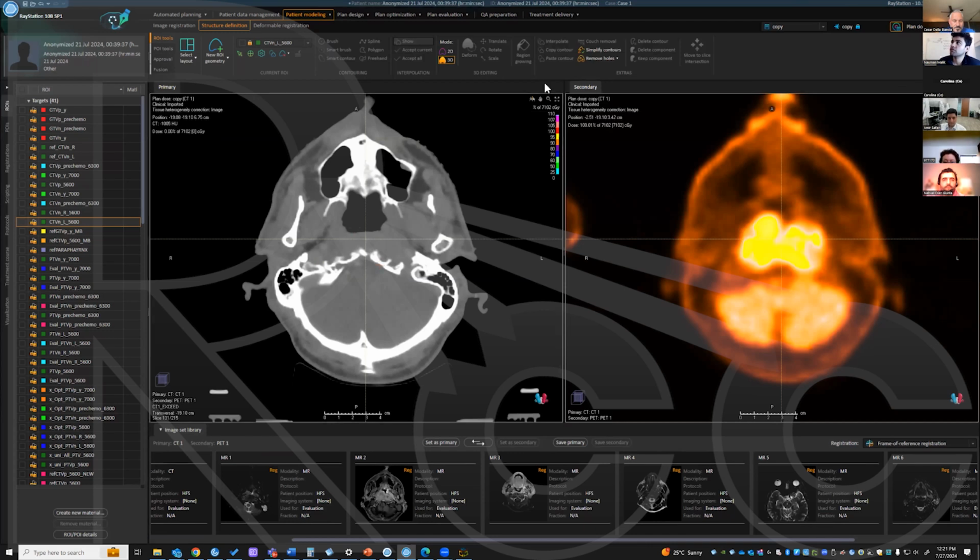The first thing you would do is check your fusions, patient identification, and clinical history. This patient's clinical history is that they had a locally advanced nasopharynx cancer. They got induction chemotherapy, and now they're going for chemoradiation. Some of these scans were done before the induction chemotherapy started, so you'll see there's a lot of tumor bulk there which isn't there anymore. That's kind of what we expect to see, that's the tumor response, but we're still going to cover this area to 70 gray.